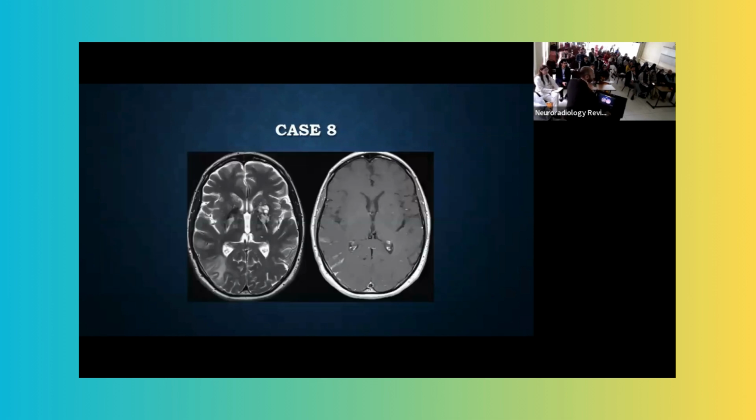So which one is this? Very typical. I'm sure Atif, I will not ask Atif, but this is another fungus, okay, immunocompromised patient. We have gelatinous pseudocysts in the basal ganglia. We have leptomeningitis also, and we can get cryptococcus with this as well, okay?